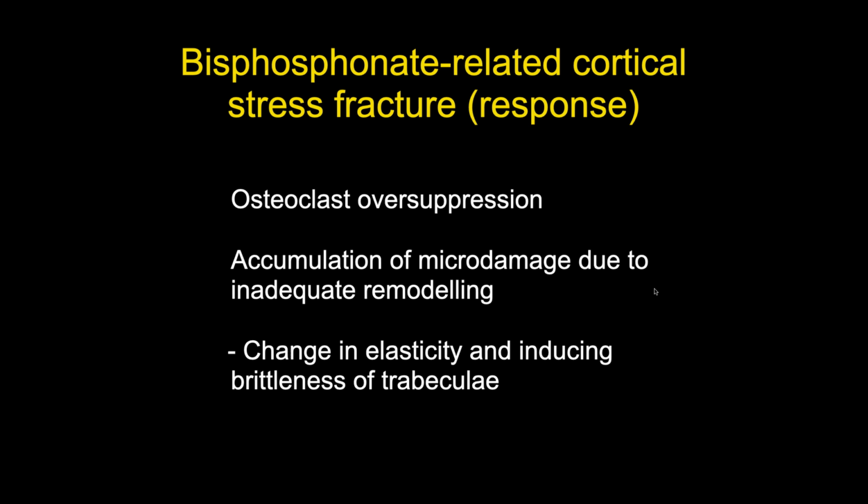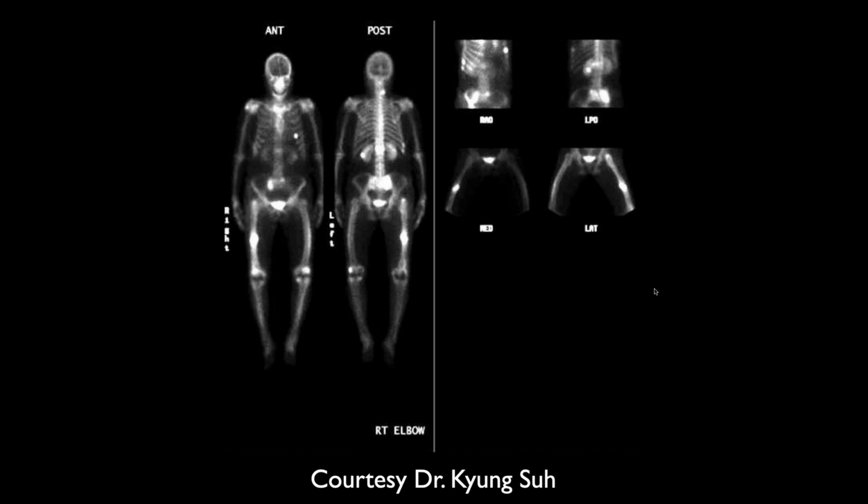Well, you see the other femur bowed, and John is showing us bisphosphonate, and she's ready to fracture. Is she already fractured, John? Well, she's getting pretty close to it.